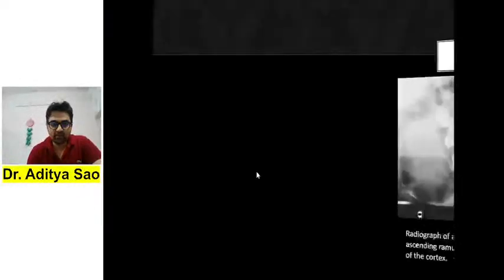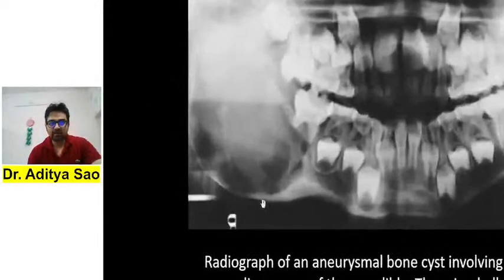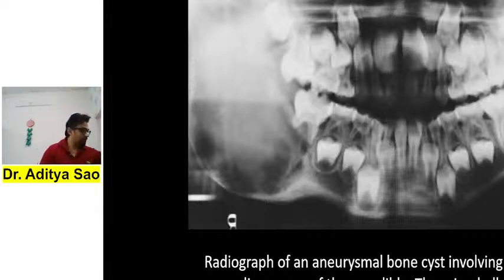This is a very commonly asked question. Now you can see here, this whole area looks like a ballooned out area. Okay, this whole area looks like a ballooned out area. Just a second.